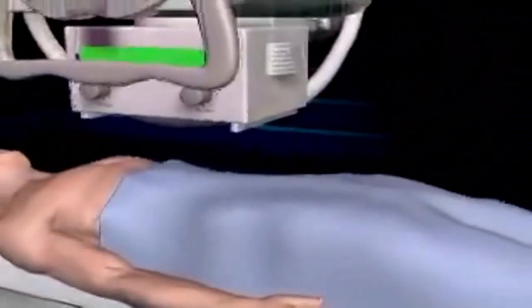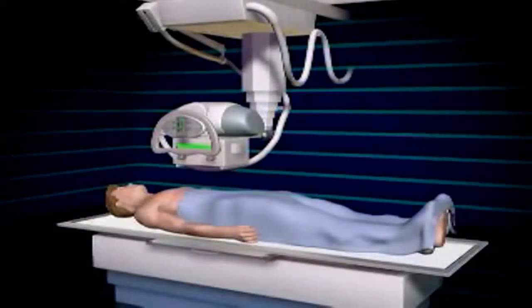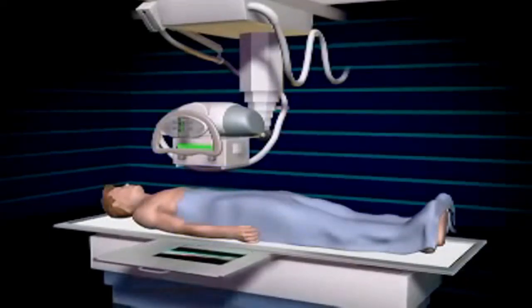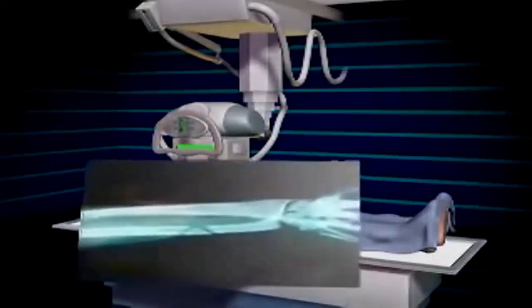as bone. During an X-ray, a radiographic film is placed behind the patient, and the patient is placed between the film and the X-ray machine. The X-ray machine then focuses the energy beam at the specific area of the patient's body. As the X-ray energy passes through the patient's body, the photons of the beam reach the film and cause a chemical reaction. The areas where X-ray energy passes through the body become black, while the areas where energy is absorbed by the bones appear white. This process produces a radiographic image, which is commonly referred to as an X-ray.